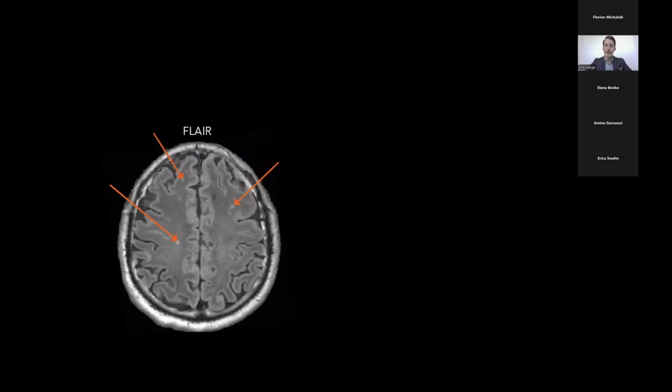And then next up is myelin imaging, and here we have an MS patient with several white matter hyperintensities. We can all clearly see the lesions, but the hyperintensities all look the same, right? Today, typically, you would report on the number of hyperintensities, any new lesions, or potentially total lesion load if you have a tool like SyMRI, which Elena just presented. With SyMRI, you can take this one step further by also characterizing the severity of the demyelination.